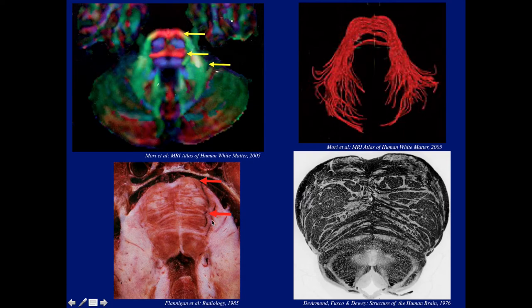Very similar to what we see over on the specimen and on the tractography, except they're bunched together because of the limitation of DTI resolution.